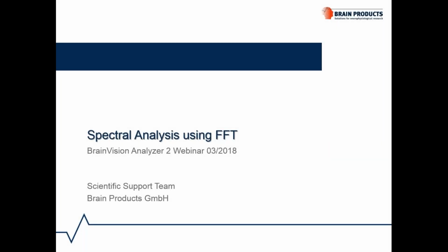Hello everybody, and welcome to our third BrainVision Analyzer 2 webinar for this year. As implied in the topic, today's webinar will be about spectral analysis. You are about to grasp the basics of spectral analysis, mainly focusing on Fast Fourier Transform.